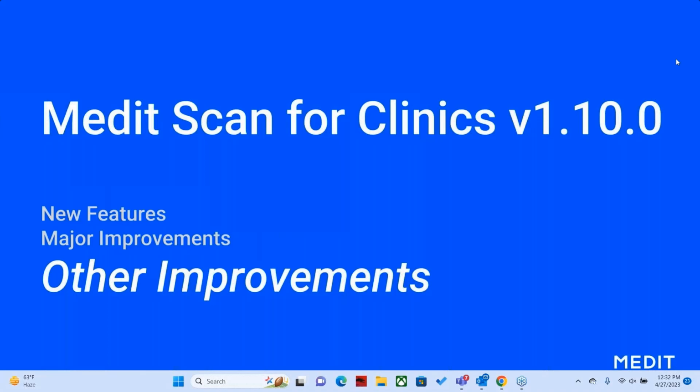Next, let's talk about other improvements. Before covering them, I want to mention that we are working on improving background processing for bite alignment. So after the update, you will be able to see that compared to the previous version, the waiting time for the process has been reduced.